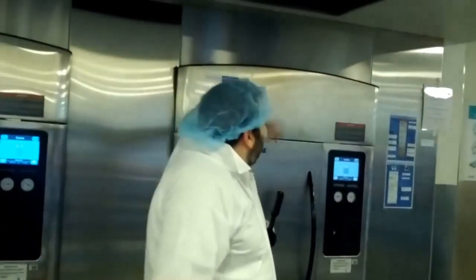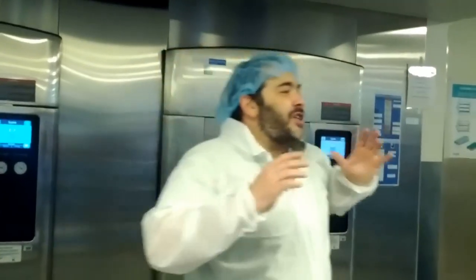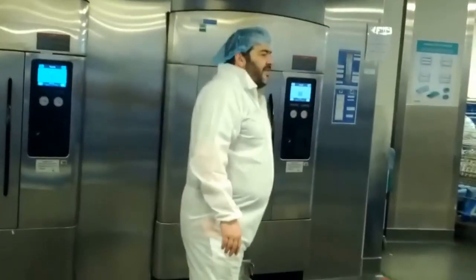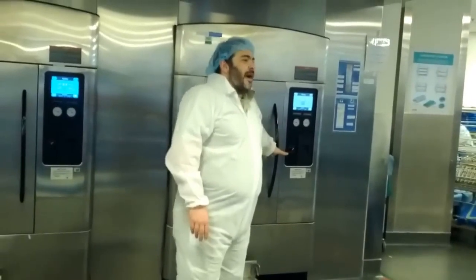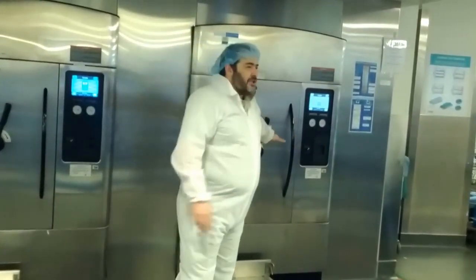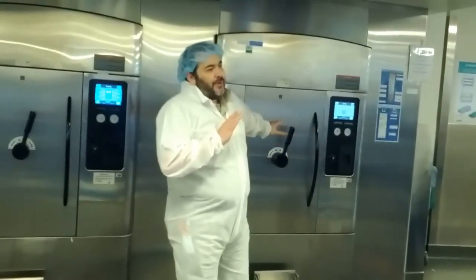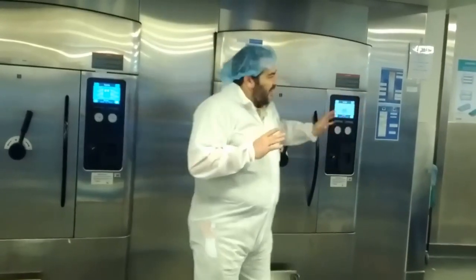Outside, which you can't see, there's a jacket. The jacket keeps the chamber warm because we have the same pressure and temperature in the jacket as we do inside the chamber. That prevents condensation. Another piece of anatomy of the sterilizer is the thermostatic trap. The thermostatic trap closes off the passageway for air and steam when you reach proper temperature and pressure inside the chamber, so we can start building up steam pressure and temperature inside there.